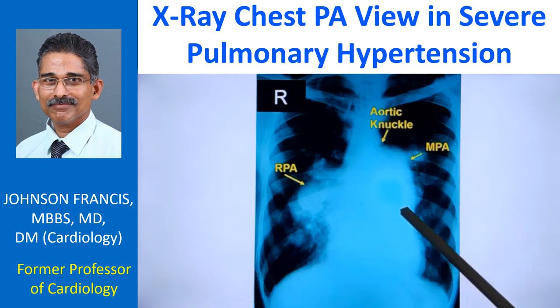The only definite finding here is gross severe pulmonary hypertension and some right atrial enlargement. The cause, of course, would have to be investigated by echocardiography, though there is some suggestion of ASD with pulmonary hypertension.